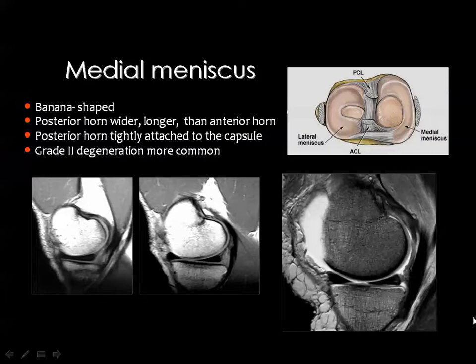area. Then if you look at the knee joint, you will see the medial meniscus, and you can identify it. If you have a section like this, then you are cutting through the anterior and posterior horn, and there is a gap in between. Then if you have a section through the meniscal body, and you have a structure almost similar to the intervertebral disc, then this is the meniscal body, and this is the anterior horn, and this is the posterior horn. And you know the anterior horn by the presence of the patella, and the posterior horn is directed towards the popliteal fossa.